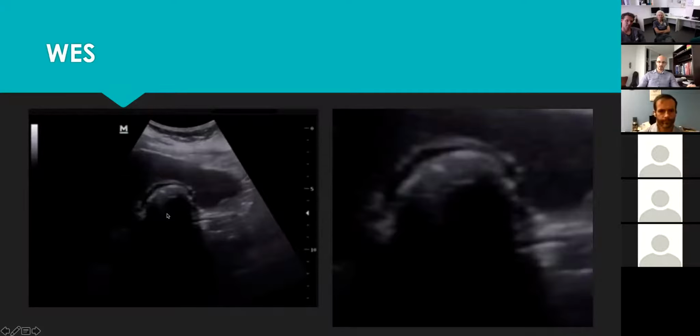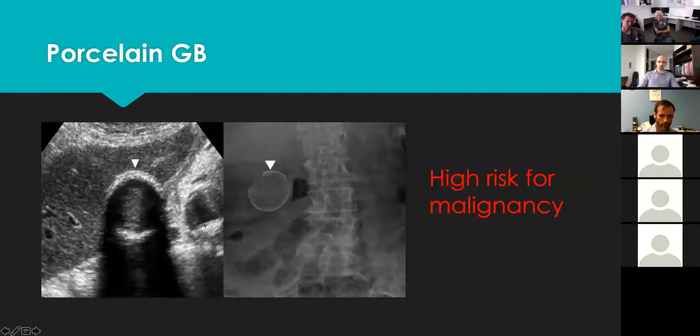Because right after this, there's another pathology in the gallbladder called porcelain gallbladder. Again, I don't know how much of this detail you are going to get into in the ICDD exam, but for example, this is a very common question for us, differentiating between the porcelain gallbladder and a big stone. So porcelain gallbladder is when you get a calcification in the gallbladder wall. The importance of it is that it predisposes the patient to gallbladder cancer.